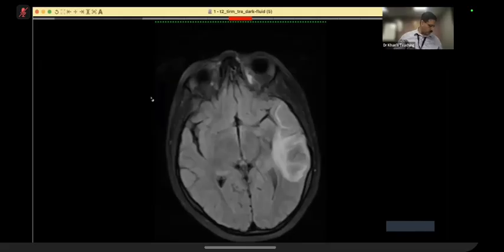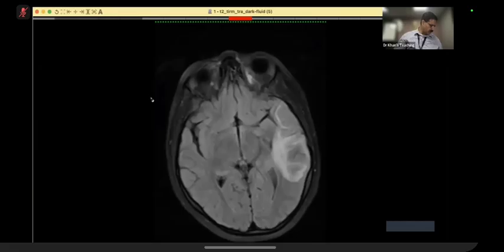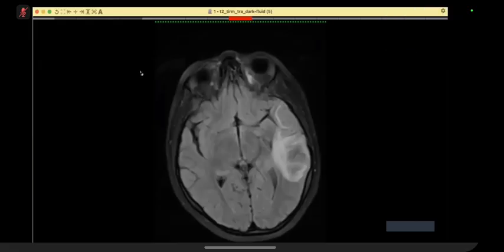Candidate 4. Yes, sir. So this is a 21-year-old female. Dysarthria for 1 day, CVA question mark, encephalitis question mark. Okay, sir. I'm requesting controls.